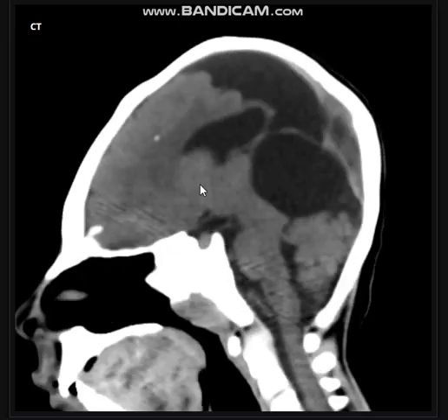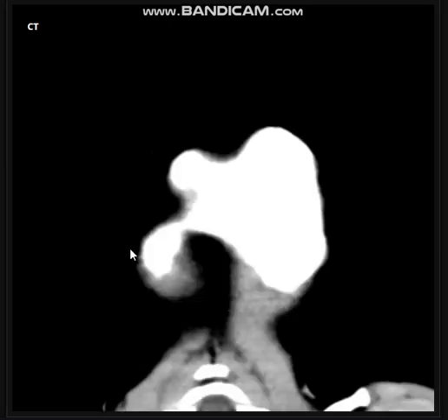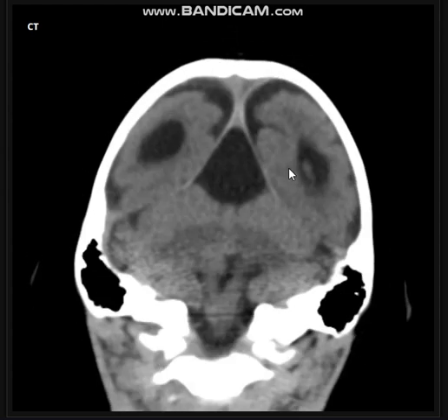When you continue with the case, you can see here there is an arachnoid cyst in the quadrigeminal cistern that will lead to splaying of the cerebral hemispheres here on the sagittal images, and the coronal just showed you clearly the scattered microcalcific foci here.